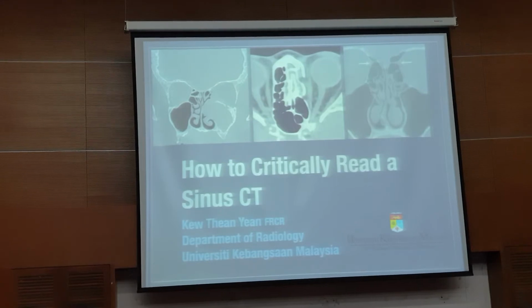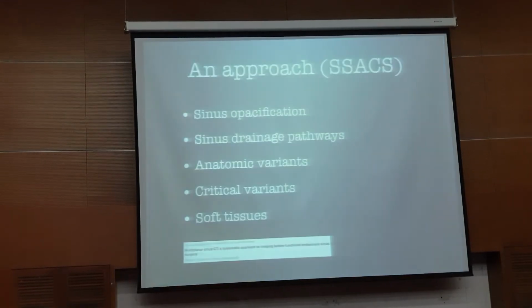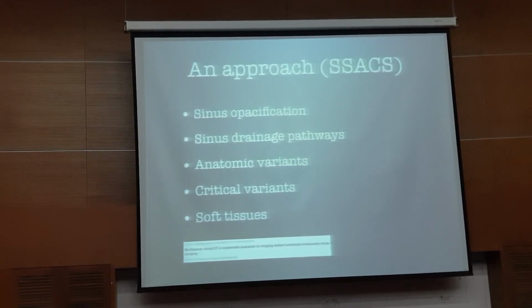So obviously, when a paranasal sinus CT is requested, usually it is because the patient presents with symptoms, or there's a plan to do FESS in these patients. So for me, or at least in the literature, there are many ways to decide how to report these paranasal sinus CTs.